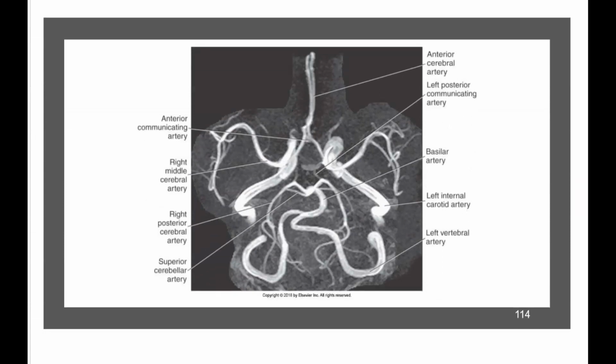And this is another example of it all put together without them cut out. So typically, we take this and we'd cut out the posterior circulation. So we'd take this and we'd cut it just like this. We come around and we come up, and we cut this out. And then we'd have the anterior portion and we'd have the posterior portion, and we'd process these separately.